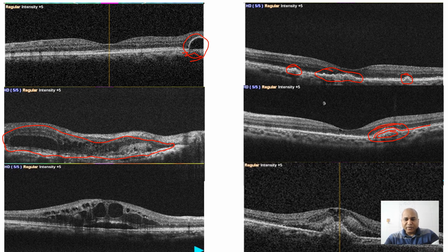Coming to the final pre-assessment image, we have 2 images here. We can see the retina in this portion has lost its foveal depression. Instead, we have thickened retina here with cystic clear spaces and some amount of space which is clear in this area.